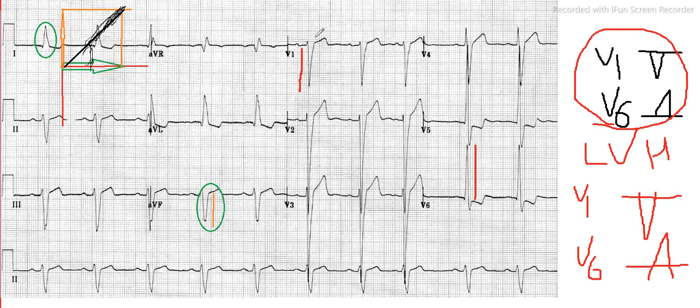So in left ventricular hypertrophy, in V1 you will have a negative deflection which is more prominent. In V2 also you will have a negative deflection, whereas in V5 and V6, the lateral leads, you will find positive deflection. Sometimes if there is left atrial enlargement associated with left ventricular hypertrophy, you can look at lead 2.